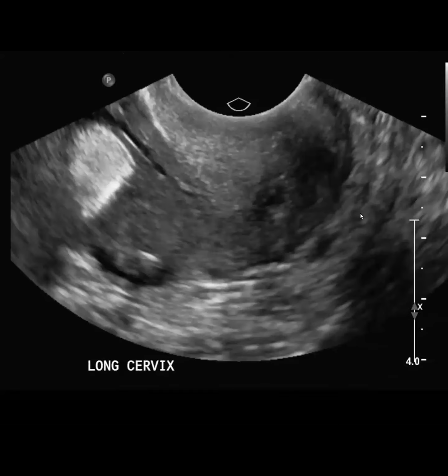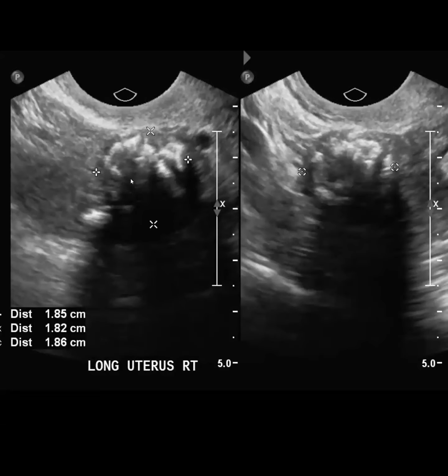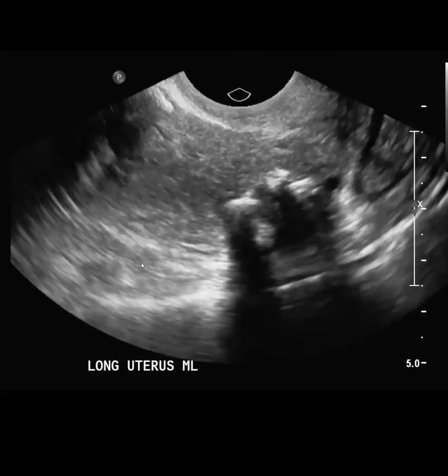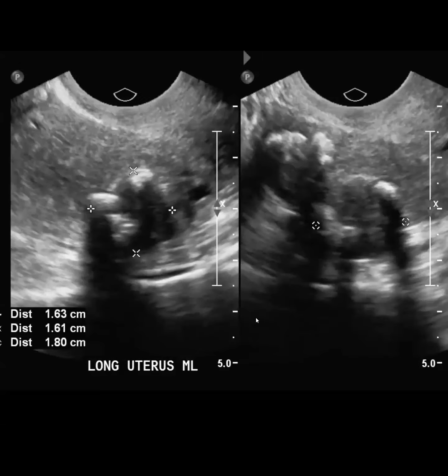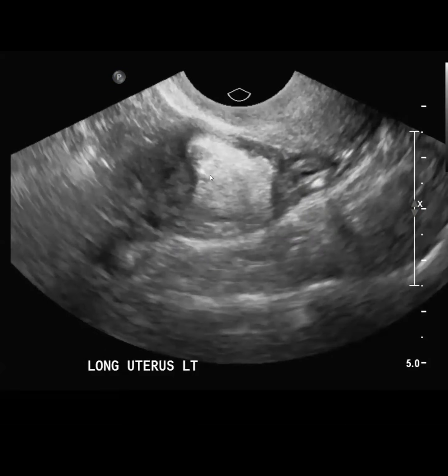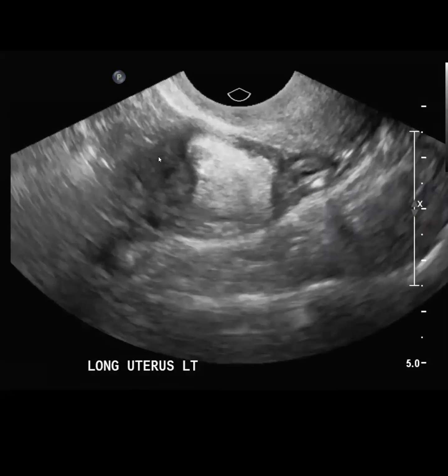Okay, so this patient was having pelvic pain and they did an ultrasound. And you can see that there are some calcified fibroids, so echogenic with a lot of posterior shadowing. So it just looks like a calcified thing in the uterus, which we would presume is a fibroid. Another calcified fibroid right there. So there were several calcified fibroids, and then there was this thing, and it looked like it was actually in the uterus, this bright thing.